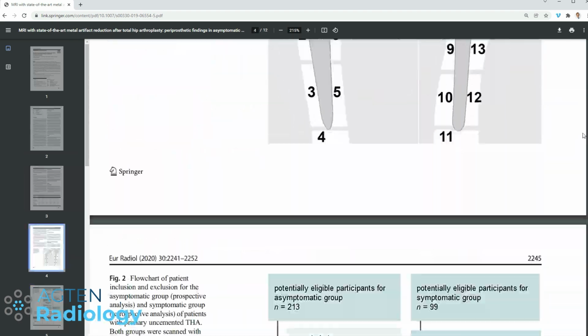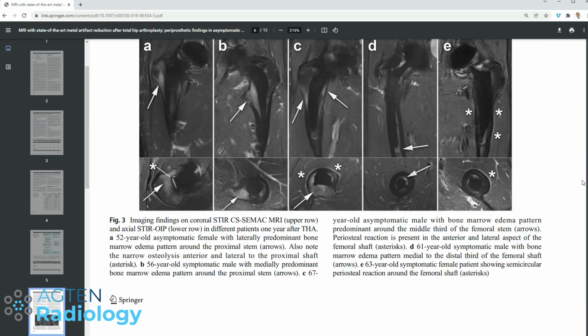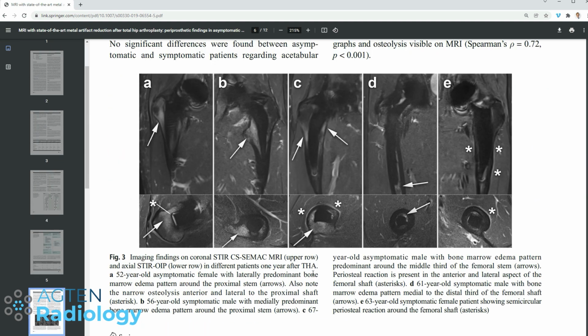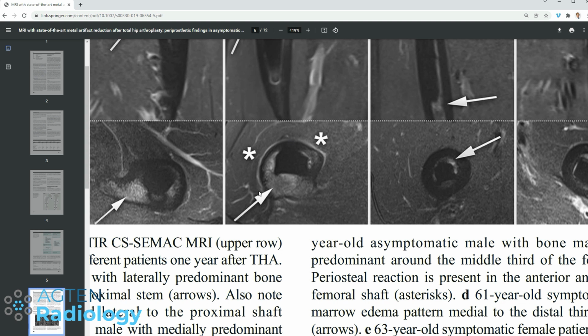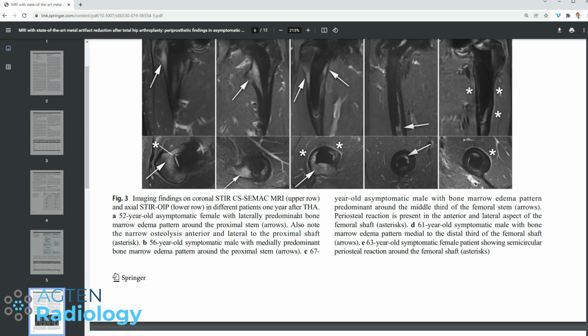And you can do all this study stuff and divide it into these different zones, etc. You can also see here, maybe I'll zoom in, this periosteal reaction here, all around. Nothing, and then a bit of bone marrow edema, no periosteal reaction here. So this is something that's very subtle also on this image, these periosteal reactions, something that we have to look out for.